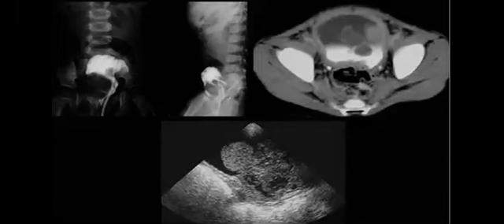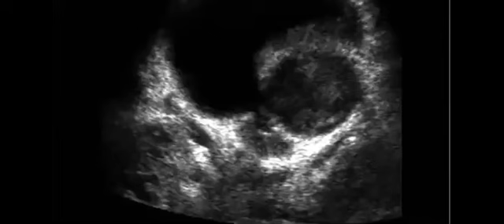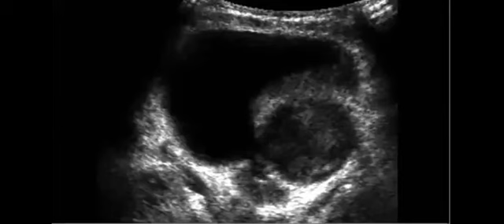This one can be hemorrhagic cystitis, but it looks like a bigger or older patient. But when you find a mass in a pediatric patient, you are almost always talking about rhabdomyosarcoma. On ultrasound, the bladder is anechoic in a pediatric patient with a solid mass projecting into the bladder.